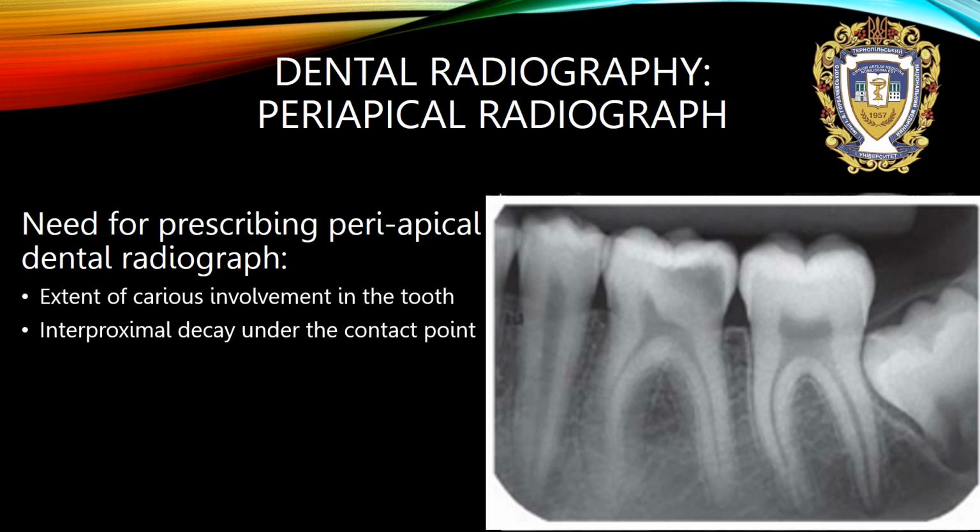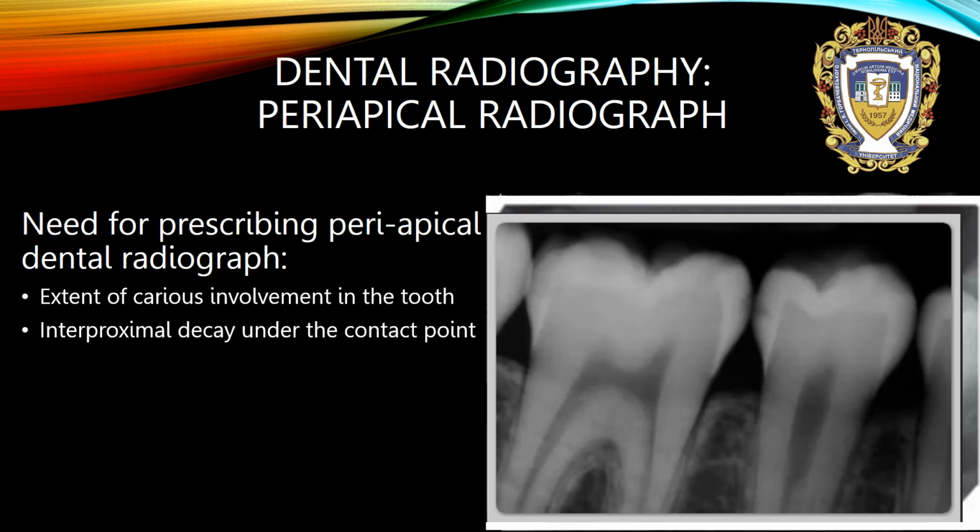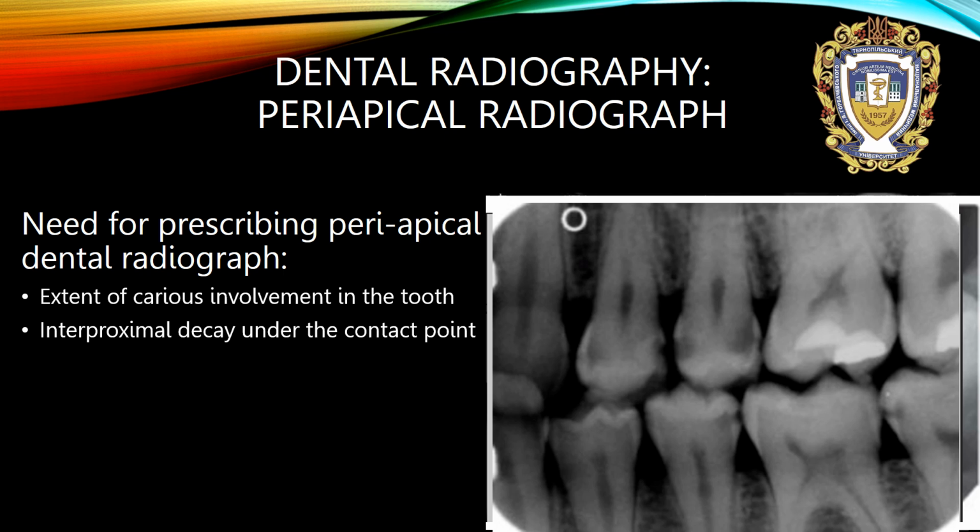Interproximal decay under the contact point. Please, colleagues, be very attentive. These kinds of caries are not visible intraorally, but we need to pay attention to interproximal surfaces to notice them in time. Next situation, multiple interproximal decay.